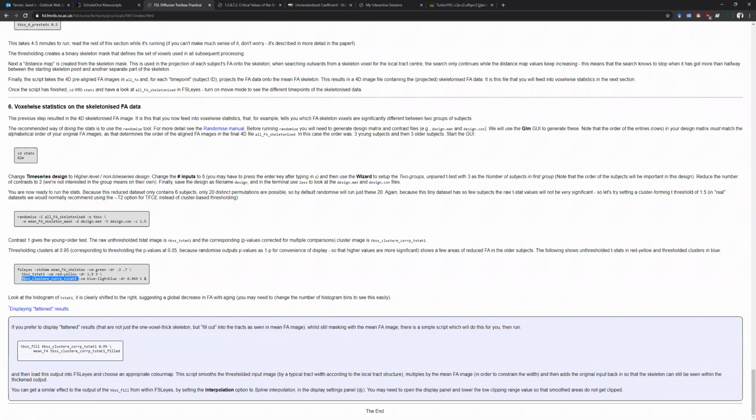And then here they're also pulling in a corrected p-value. They used a different way of correcting for multiple comparisons. We did a TFCE method. And in that case, they're doing that as blue, light blue. Their range of values is 0.949 to 1, because this one is essentially p-values, and we just want to show the top, the p less than 0.05.